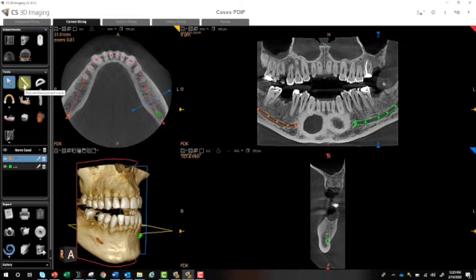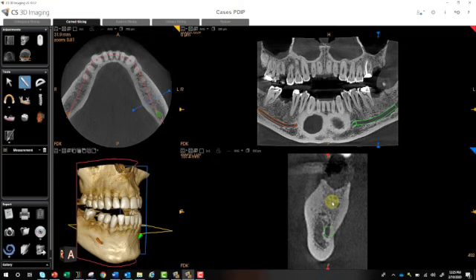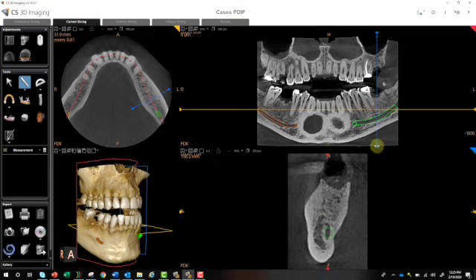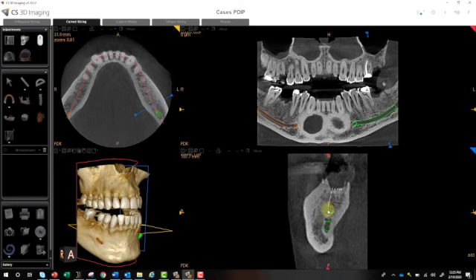You can, number one, select your little ruler, and I can zoom in and first find where I want to take my measurement, change my slicing and my angles, and now do a single click from wherever I want to begin measuring to the next click.